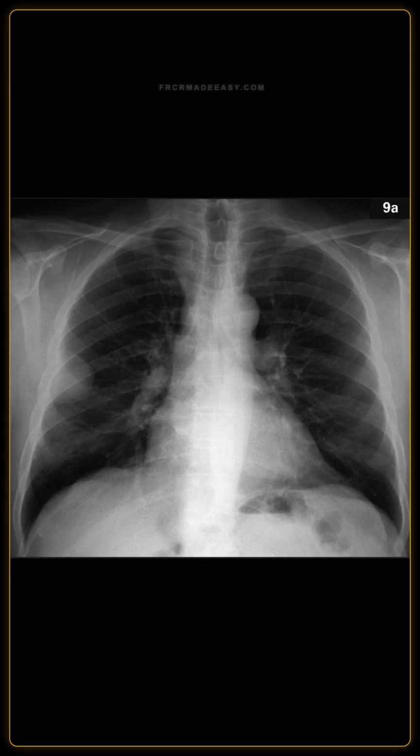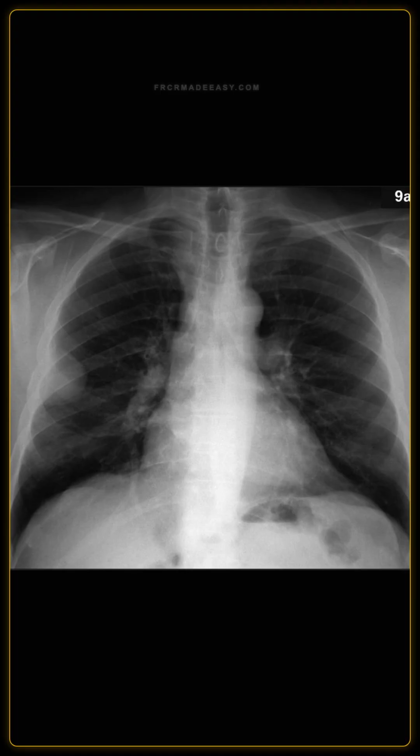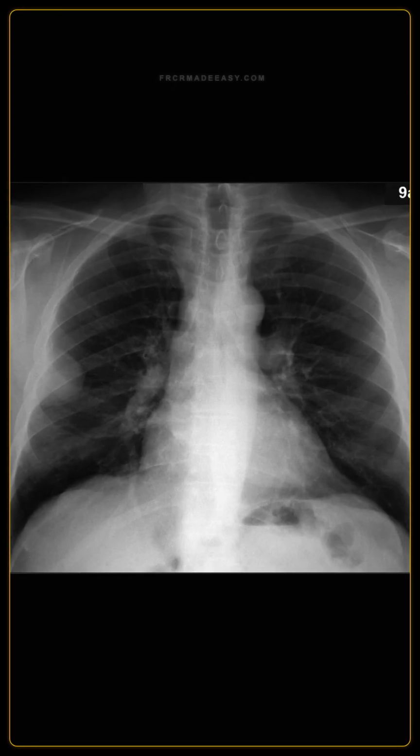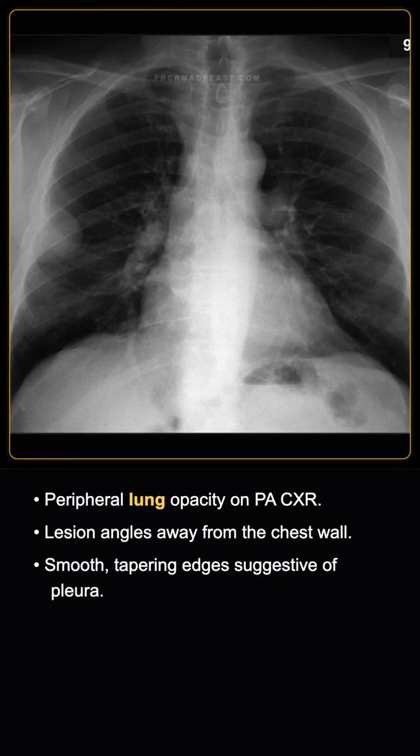A 45-year-old male smoker presented with a cough. I'm showing you his chest radiograph. Describe the findings.